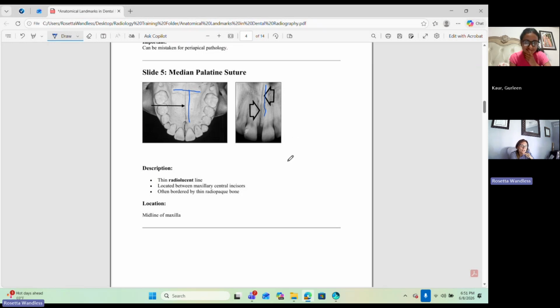At certain points, the sutures take time to close. So in my head, I'm looking at this and thinking, I think this hasn't closed, so this may be a younger person. Different, weird, right? And not only that, it could be that it never closed as an adult. Well, that's a problem.